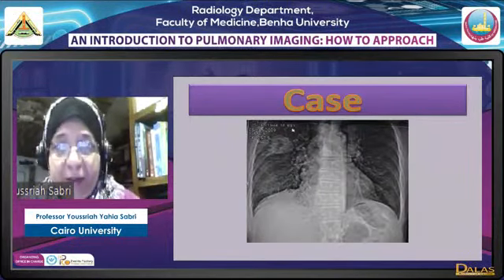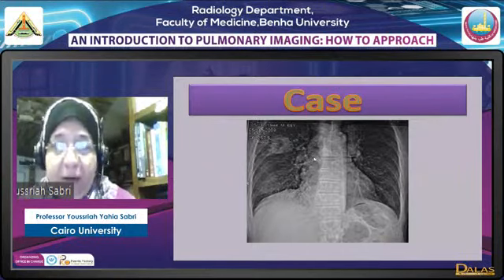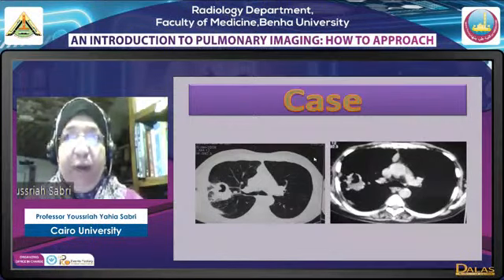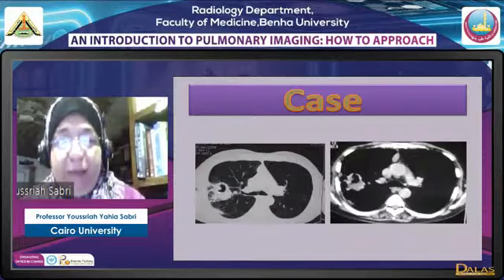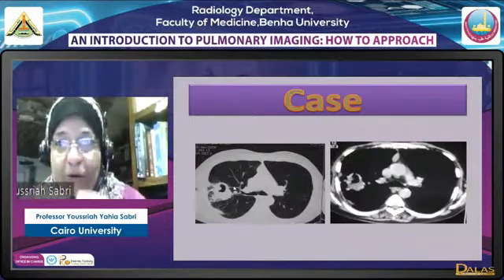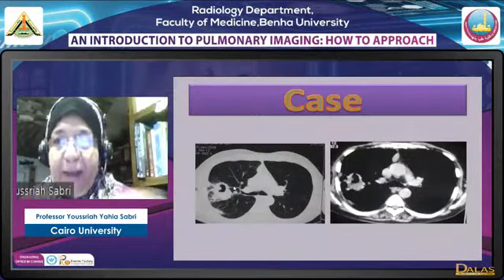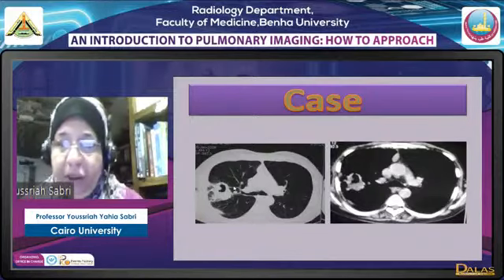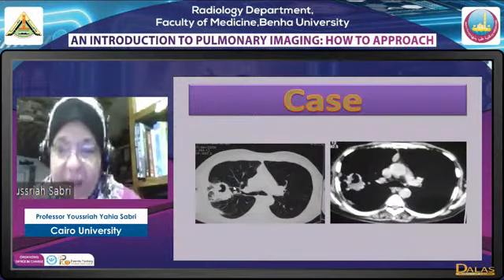We have a male and 65 years old. عندنا ماس. جوه this mass we have a hole, a cavity. What's a cavity؟ مهم جدا نعرف مفهوم الكافيتي، برضو من الحاجات اللي بتعمل لخبطه. ايه الفرق بين الكافيتي وايه الفرق بين السيست؟ مفيش اي صله بين الكافيتي والسيست اصلا. بمنتهى البساطه الكافيتي I have to have a lesion and inside this lesion I'm going to have a hole. يبقى الاول لازم في ليجن. الليجن ده قد يكون ماس وحصل فيه هول، قد يكون نوديول وحصل فيه هول، قد يكون كونسوليديشن وحصل فيه هول، لكن في اصل ماس، في ليجن اصلي واتخرم هذا الليجن حصل فيه كافيتيشن.